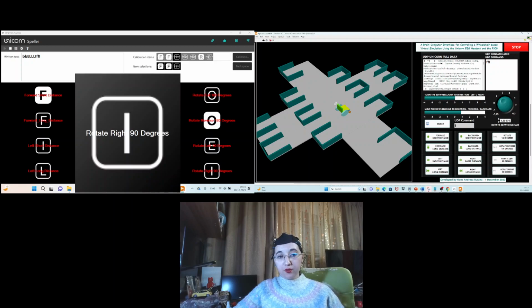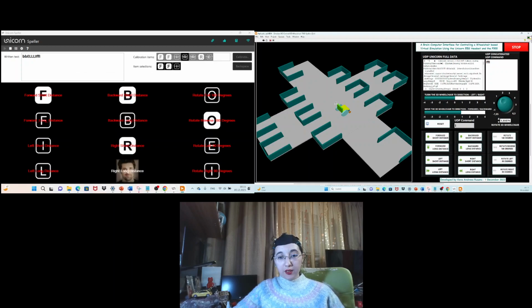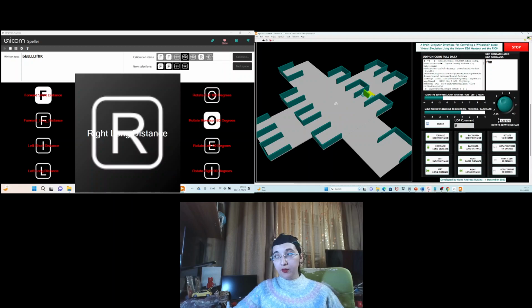Continue with right long distance 2 times. So that's perfect.